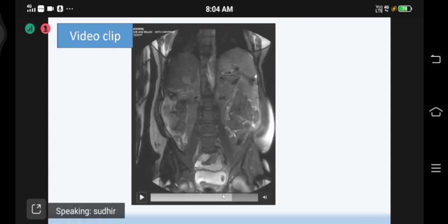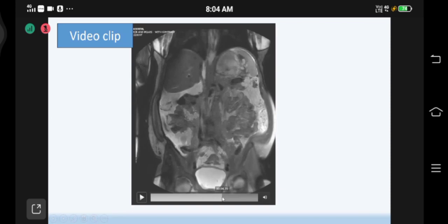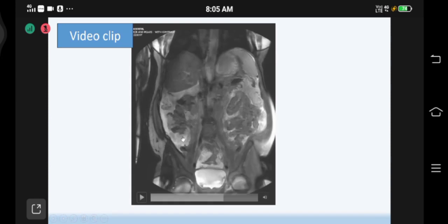And from here, I want everyone to focus. Let's follow the clockwise rule here. Then we ascend towards the right iliac fossa. You can just see here. Then as I slowly go towards here, you can see the cecum is a little bit pulled up, and there is an irregularity along the serosal aspect here, and you can see fluid getting into the paracolic gutter and subhepatic spaces.